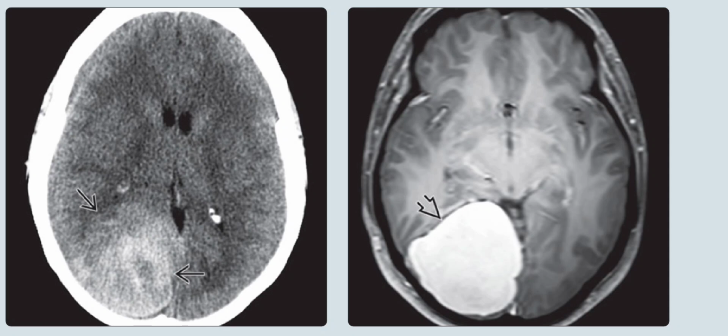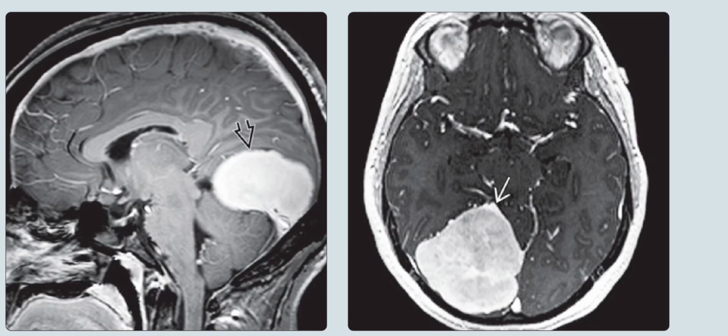The right is the axial T1 contrast-enhanced MRI in the same patient, and it shows a large, intensely enhancing right occipital mass. Left is the sagittal T1 contrast-enhanced MRI, and it shows the well-demarcated, intensely enhancing mass, which is seen to be abutting the dura. Right is the axial pre-surgical contrast-enhanced SPGR, and it shows a subtle dural tail along the tentorium cerebelli. Preoperative diagnosis of meningioma was confirmed at surgery.